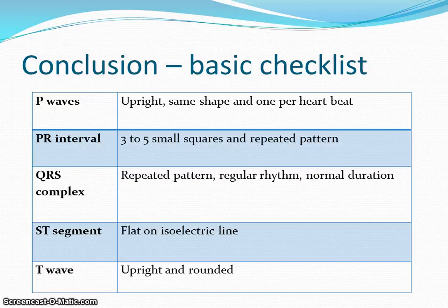There are other extreme heart abnormalities. However, within a sports setting and generally fit and healthy individuals, such cases as heart block would not be so relevant. When using an ECG in any setting, it is important to understand the key components of the reading and have knowledge and recognition to identify characteristics of the common abnormalities and arrhythmias covered.